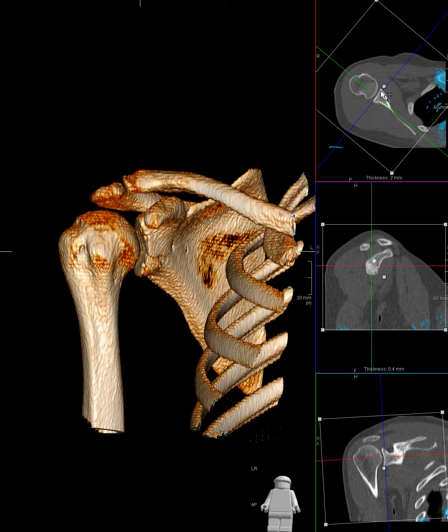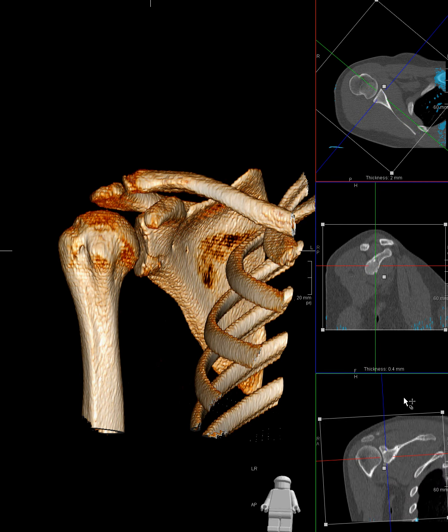So we use the axial images to prescribe the coronal and sagittal planes, and you can see the green and blue lines represent the appropriate imaging planes for the sagittal images. You can see the blue lines sliding back and forth. Surgeons really like to see this sort of contour of the glenoid surface, so something that's very parallel to the surface. And then this would be the coronal plane to the shoulder. You can see the glenohumeral joint nicely in profile there. Okay, and you can see the green line scrolling through that.